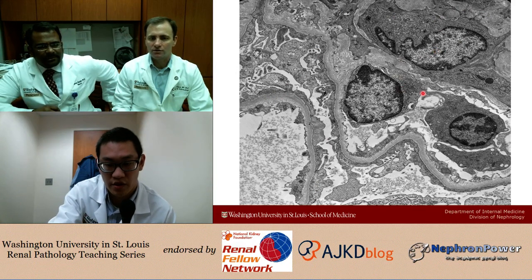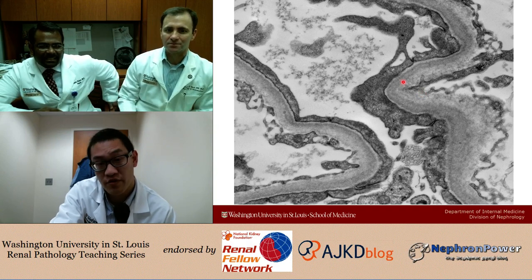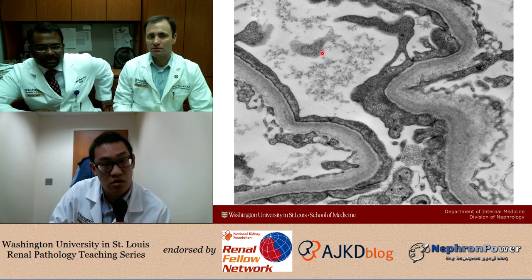All right. Okay. So I think we're ready to make a diagnosis. Here's one more image, just another close-up of the basement membrane. I think this just highlights what you saw earlier, just at a higher power. Excellent. So let's orient again. So what space is this?